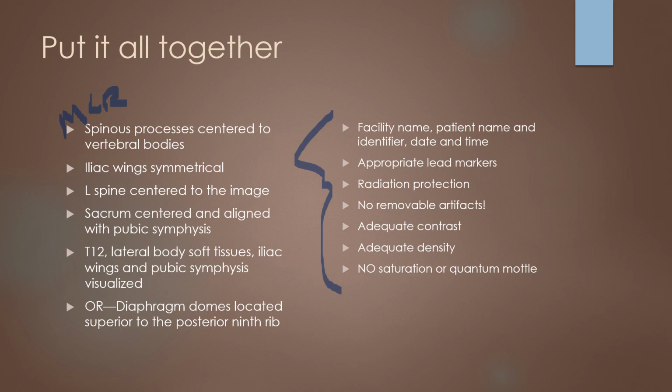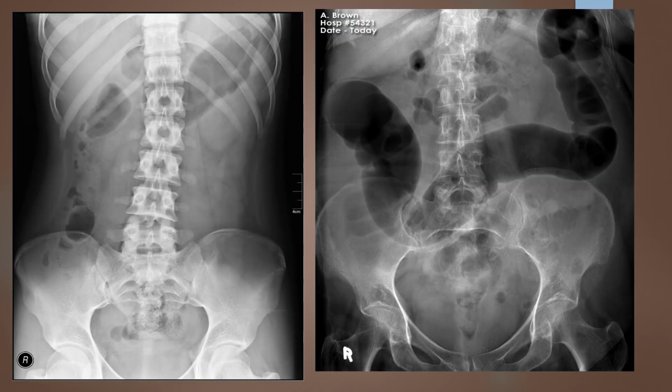Okay, and if you thought it would never come, neither did I, but here we are. We thought we'd never get here, but it is our last slide, so we're going to run through the evaluation of these two abdomens, and then we are finally done.